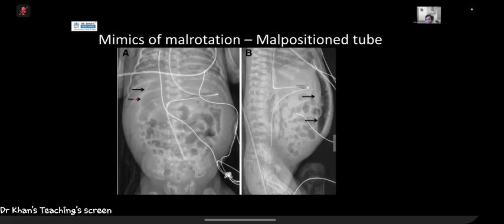So this patient actually has a pneumoperitoneum. And this is one where the tube has gone in and actually perforated through the small bowel. Okay, and the reason for that is because you see all this free air. So even though pictures can look very similar, you need to correlate with the clinical history. And this is a neonate who had just had this inserted, no prior history of long-term tube insertions.